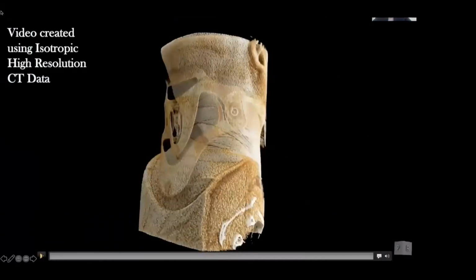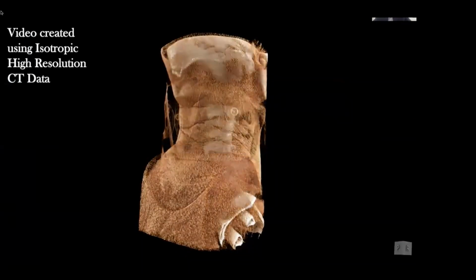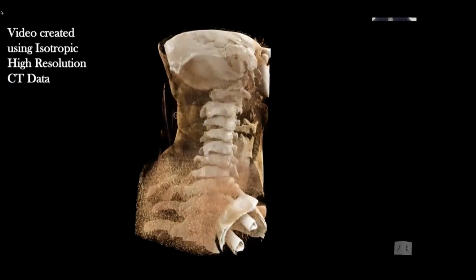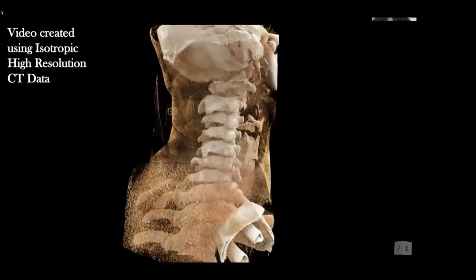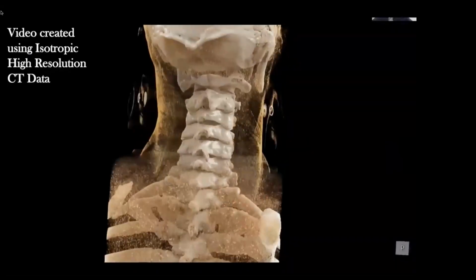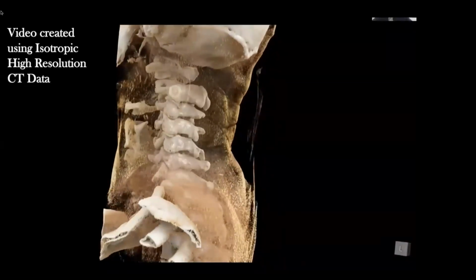And again, just to give you an overview of what we're capable of, you can see that we're able to pull back layers of tissue to depict muscle, and then to depict bone. We're able to look at 3-dimensional volumes in a comprehensive format from any orientation, in any obliquity.